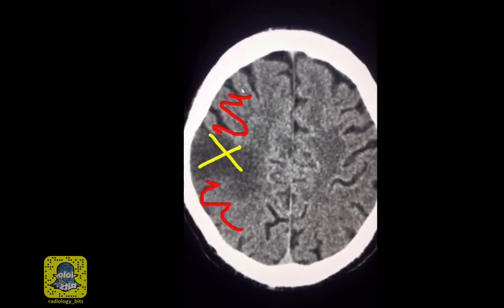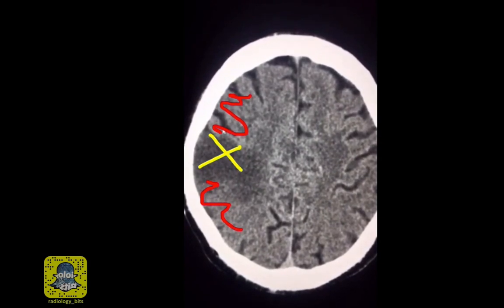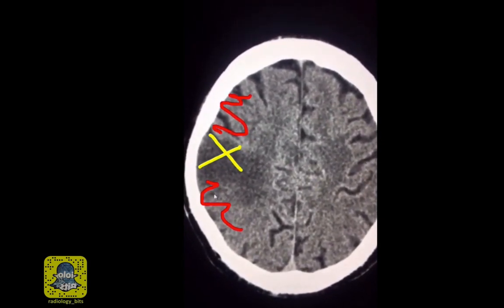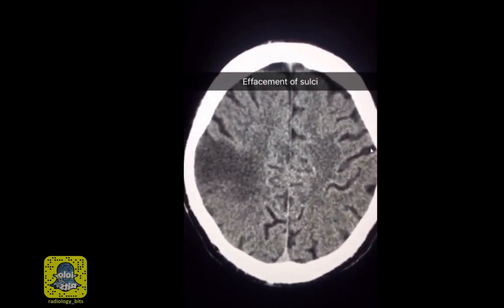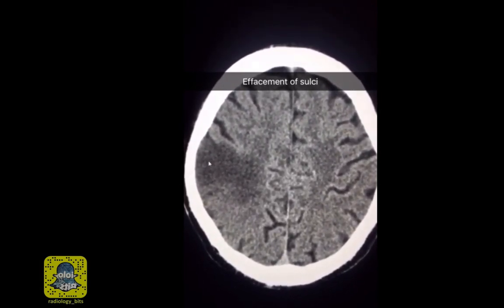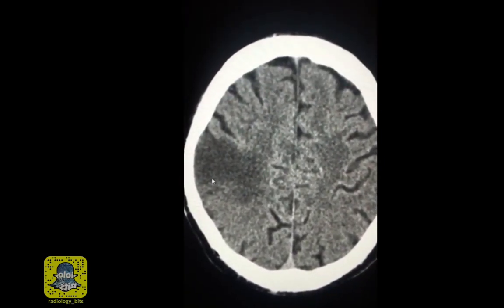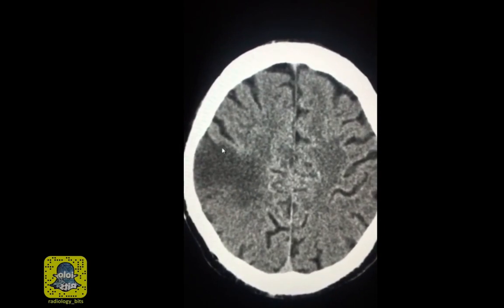If you try to draw a line that continues with the bright undulating cortex, you'll be fine till you reach here where you lose it. Add to that, these dark areas of CSF density that we call sulci are lost here because of effacement. They're compressed. Such a finding of effacement tells you that there is at least local mass effect.